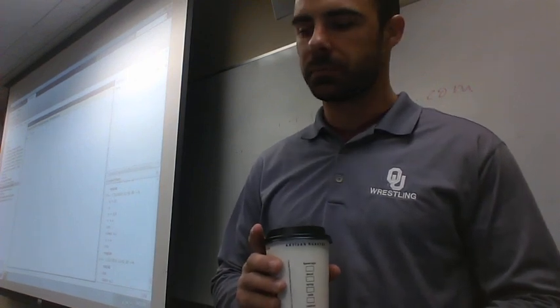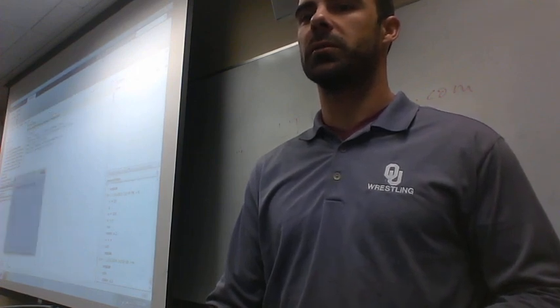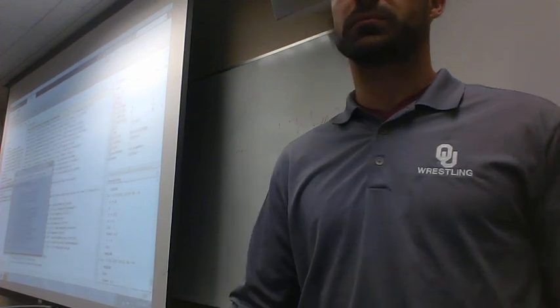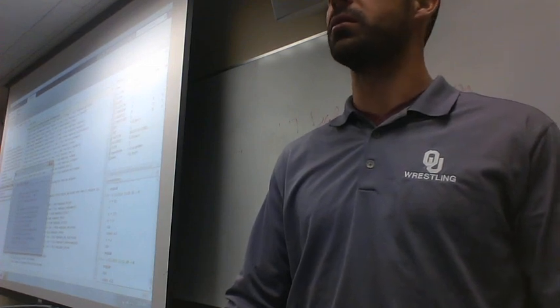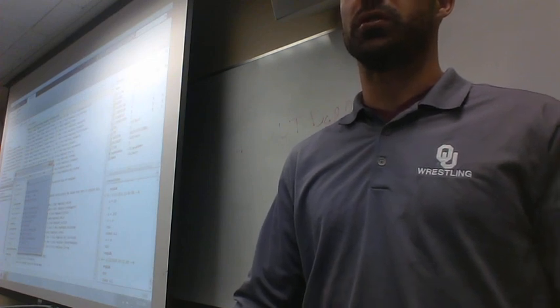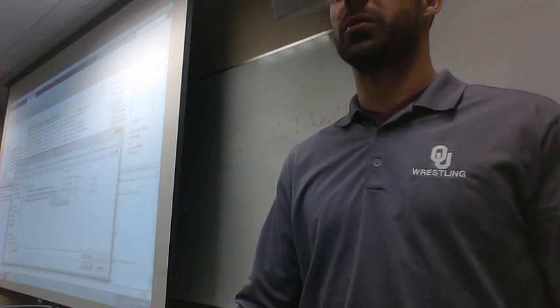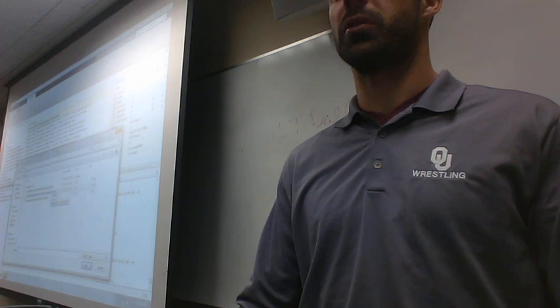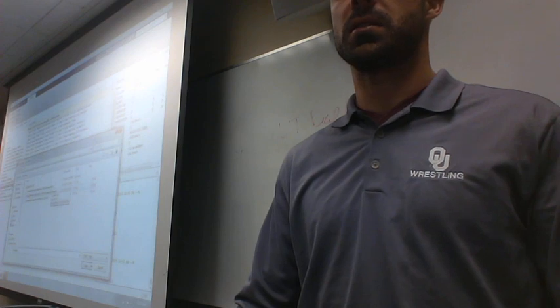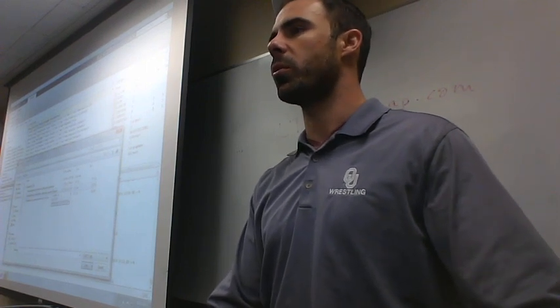Let's see here. Let's hit the EEG icon, and it should bring up EEGLAB. And then we loaded a data set, right? Last time what we did was we did load, and then we grabbed the longest named file there, and we loaded it. Is that the one that says ICA? It does say ICA, and we'll talk about what ICA means as we get along through a processing pipeline.